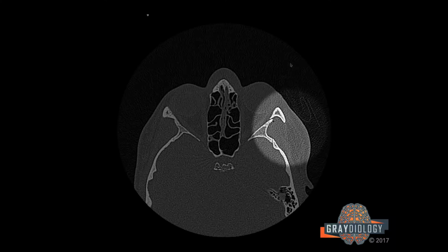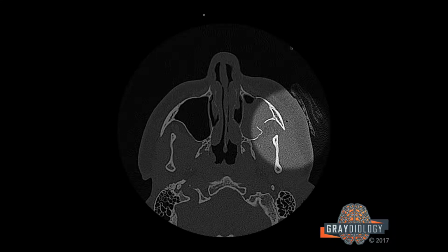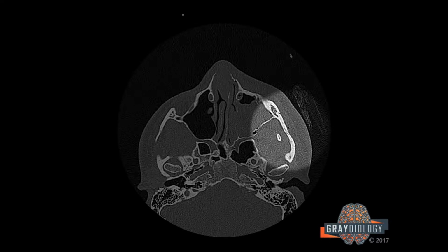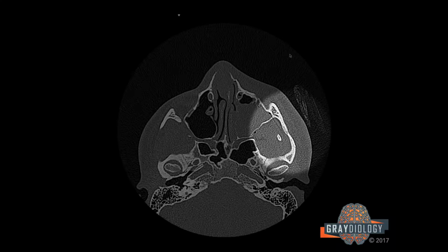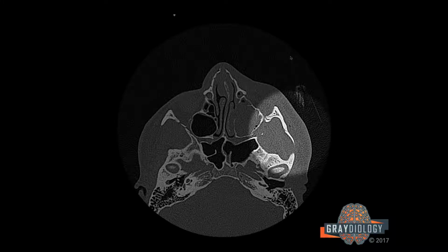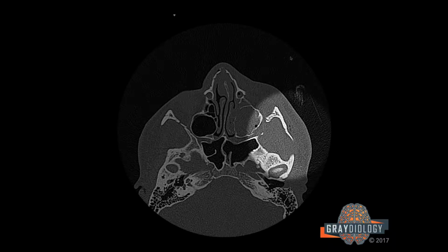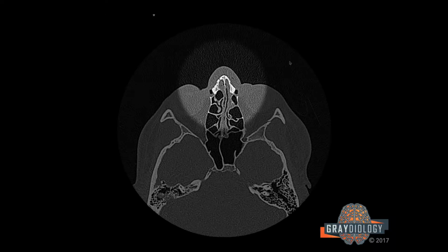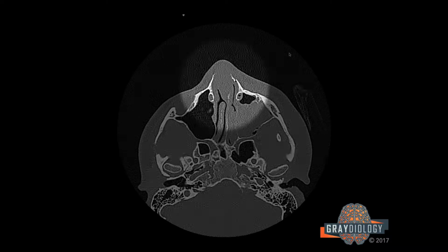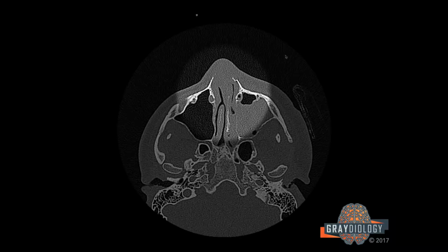Then I look at the left zygomatic arch, and we've already seen that the patient has a left facial injury with lateral orbital wall and orbital floor fractures, so this is highly suspicious for a zygomatic complex fracture, and of course we do see a subtle irregularity along the zygomatic arch. Then I'll look at the nasal bridge, nasal bones, noting the fracture, coming down to the anterior maxillary spine and alveolar ridge.